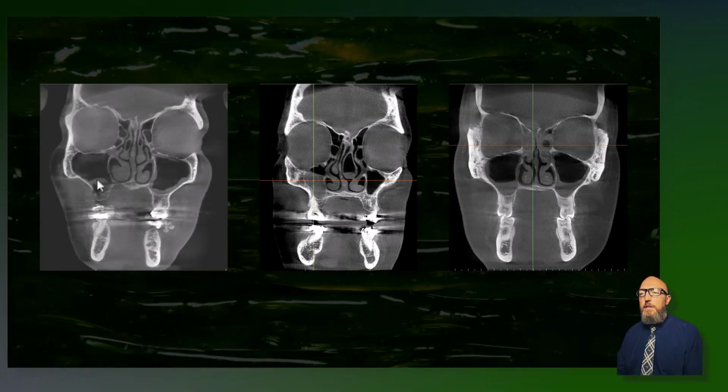All right, here's several CT examples showing the coronal slices. What do we notice here in this right maxillary sinus? A nice dome-shaped opacity, probably just a pseudocyst. Here's some just mucositis, but there is a little bit of a polypoid shape, so it could be allergy related. Maybe it's starting to obstruct the drainage. I'd have to zoom in and out of the slices to determine if that is obstructed.